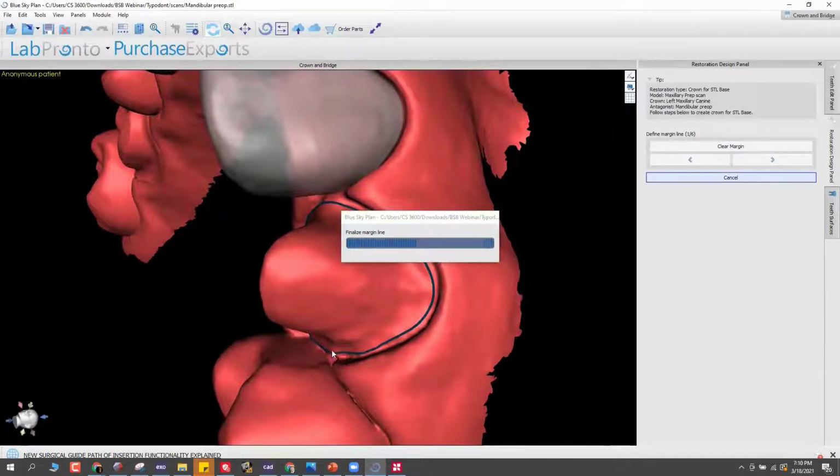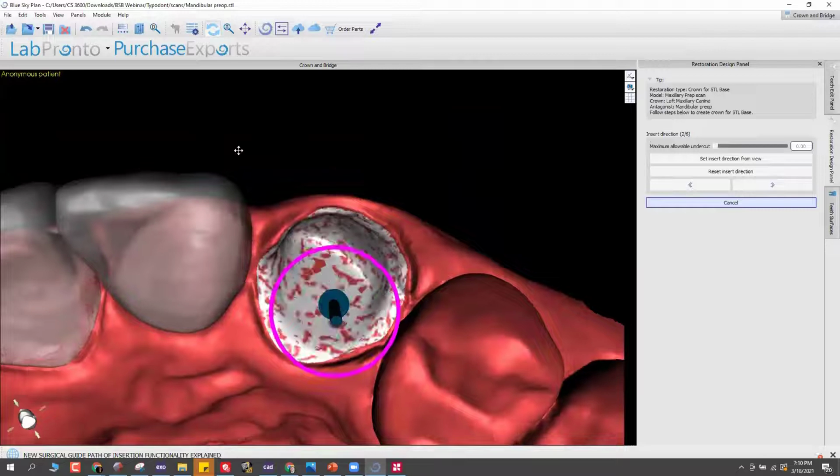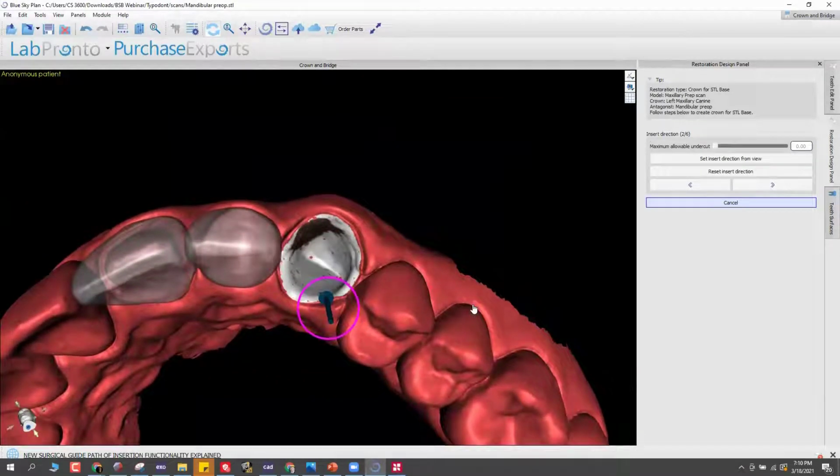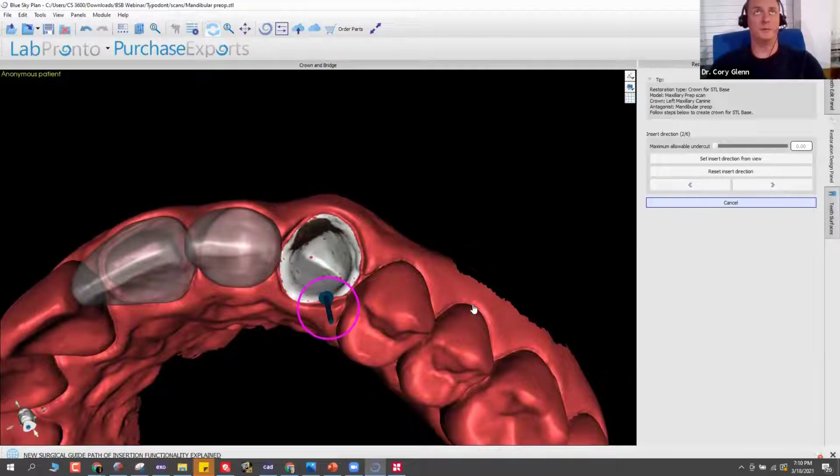Okay. When fabricating full arch temps, does the software design the abutments with the right thickness? Full arch temps. Well, the software doesn't distinguish between temps versus finals. It's all the same from the software's perspective. So if you were doing temps in that example, it's just looking at it as if it's a final crown. And like I just showed, it does show a minimal thickness, and you can set that to be whatever you want it to be. So in that regard, yeah, it would.